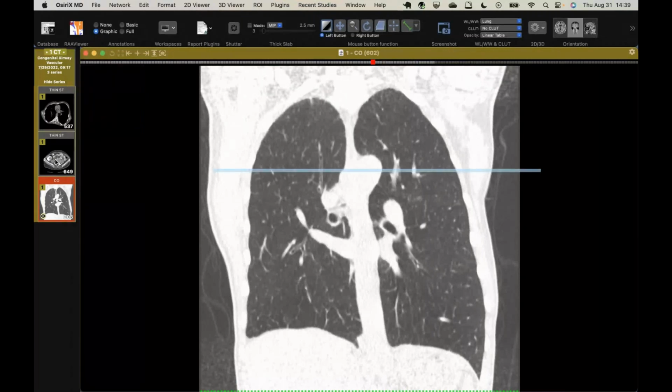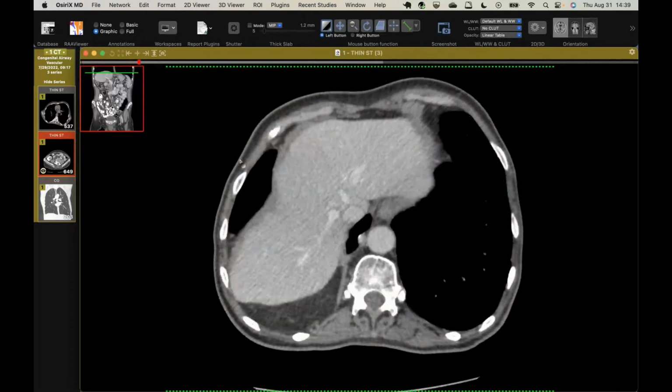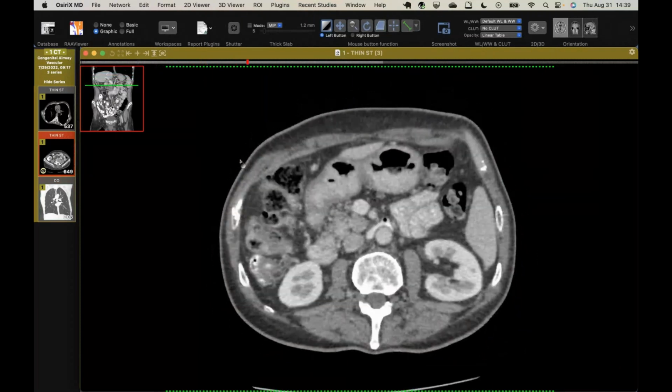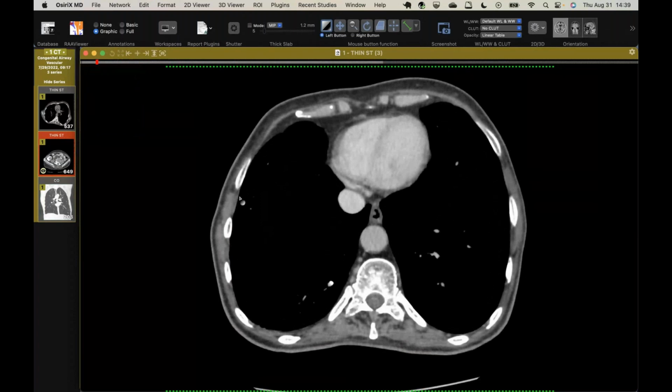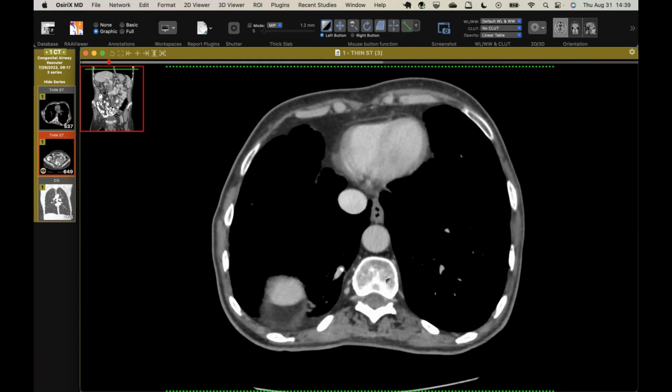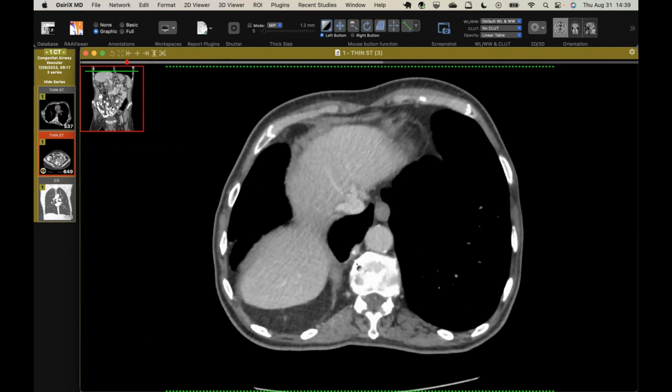The abdominal side is normal, and there's no polysplenia. So this is isolated to the chest. So we have left pulmonary isomerism, we have a single pulmonary vein, and we have systemic arterial supply, all just incidentally found at lung cancer screening. And it's kind of cool that there's atherosclerosis in this, probably because this patient was older, 70s, so high flow, high pressure flow for many years.